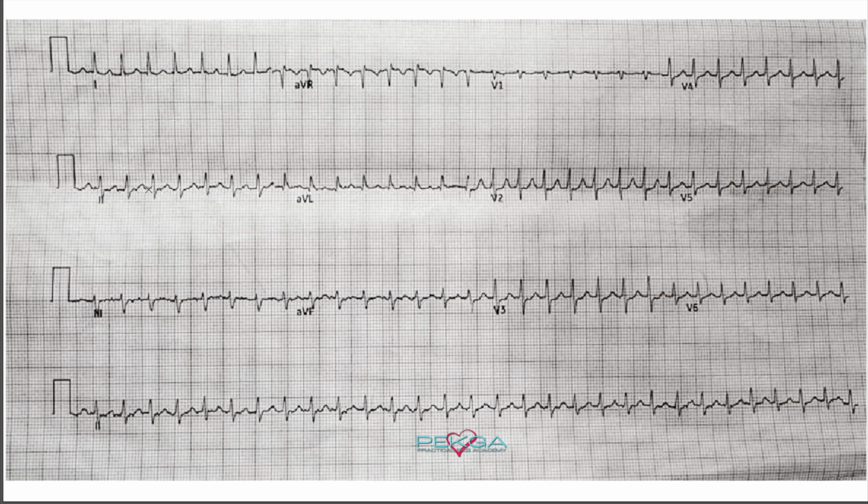Now, when we expand this to the 12 lead segment, here, we can gather a little bit more information. Let's see here. I'm looking for the P waves. I'm trying to find these P waves if they're visible anywhere. They are not. So I'm going to go back to my analytics, right? The first thing that really jumps out at you is the rate. The rate is so fast. It's really kind of plastering me like this is fast, react right away.